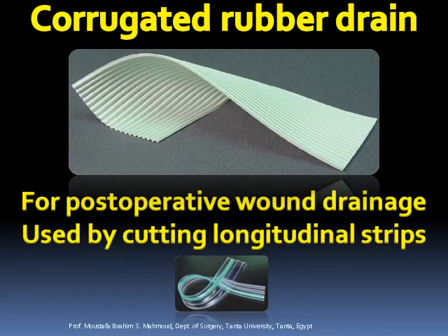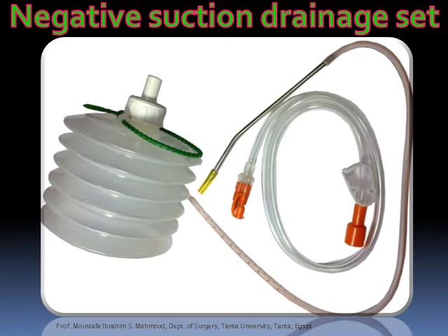Corrugated rubber drain for postoperative wound drainage, used by cutting longitudinal strips. Sterile negative suction drainage set.